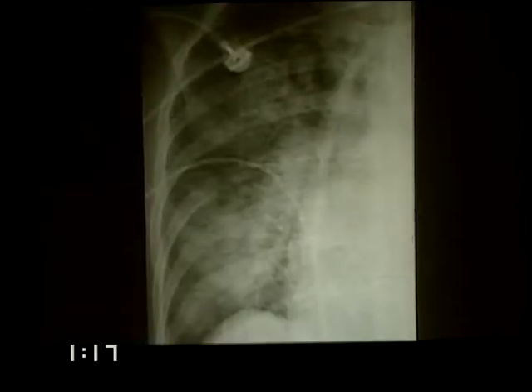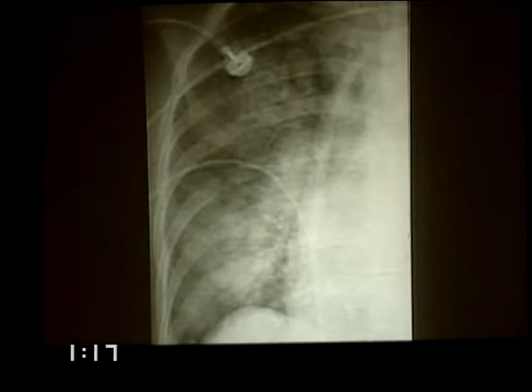Now, 2 examples of edema that are rather different in appearance. They both happen to be predominantly medullary. Airspace edema happens to be dominantly medullary. This is what one usually sees. It is rather inhomogeneous. It is rather patchy in some areas, clearly airspace disease. In other areas, there is some room for argument.